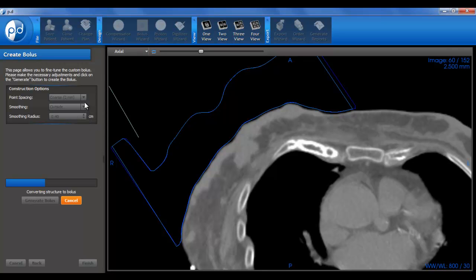The third smoothing option was the average option. The average option does both the outside and the inside and then simply takes the average position of the two. So it can kind of cause a little bit of smoothing. In cases where there were very deep valleys, we'll still remove some of the valley, but not as much of the valley as if we had done the inside or outside on their own. So sometimes average can be a reasonable blend between using the inside and the outside values.